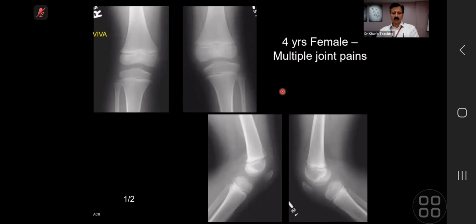So, candidate 3, you can mute yourself now. If you see here, JIA is an extremely important exam film. And again, the eye sees what the mind knows. One of the findings in JIA can be that because of hyperemia, there is accelerated growth of the affected epiphysis.